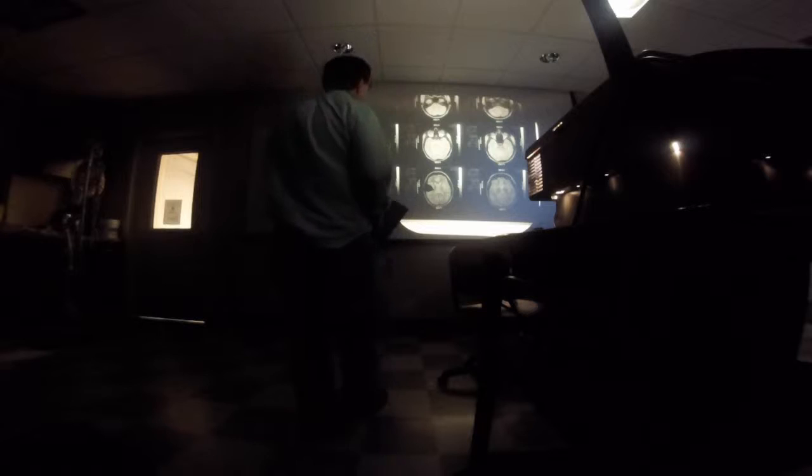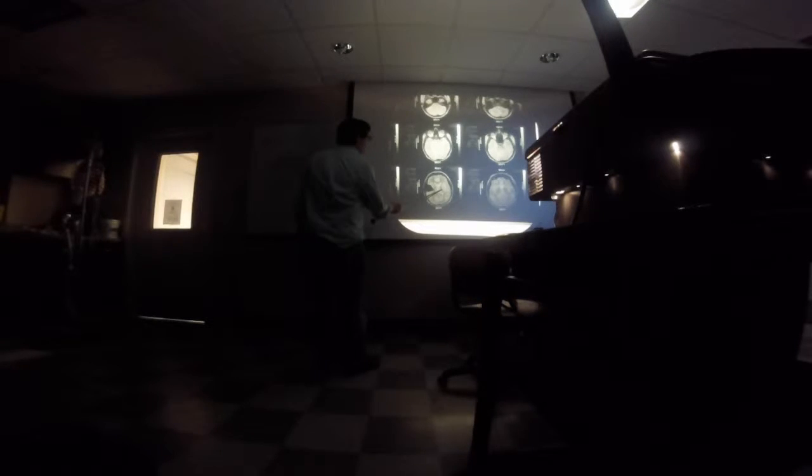Right here. This structure right here. Internal capsule. What is this going to be right here? Yeah, the right lentiform. So what is this going to be right here? Caudate nucleus, that's correct. I asked about this already, this dark vein.